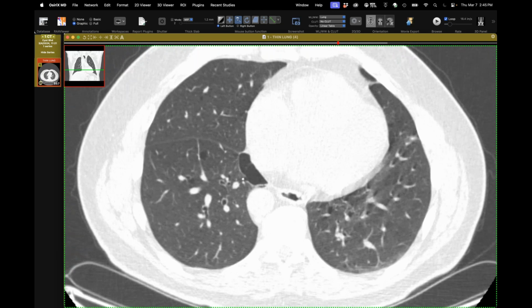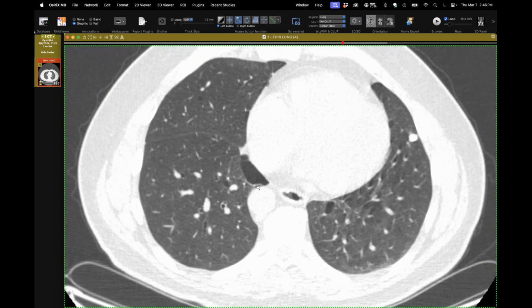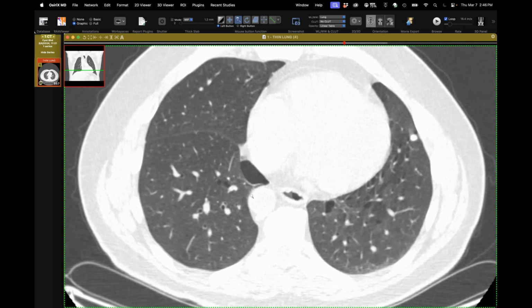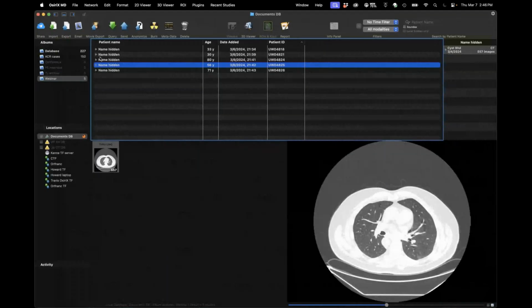And then they like to hang out near the big pulmonary veins, usually in this medial region. I've seen several of these patients present with pneumothoraces. With any cysts, of course, we see them, but I see it at a much higher frequency than other diseases. I think it's because these cysts are right at the pleural surface. So if one of them ruptures, it's much more likely to take out the pleural space than someone with central cysts from LAM or somewhere else, or even LCH, where they tend not to be so close to the pleura. So this is kind of a neat, good case here where we made a big difference.